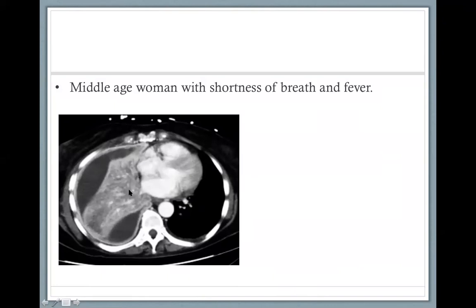And because it's collapsed, the blood vessels will crowd, so it will increase the attenuation and it will appear. So there isn't much air here, and it's becoming just like a soft tissue. So here, it is lung that is filled with air, which is outside the range of the soft tissue window. That's why you see it black. Here, there is no longer air. It's a collapsed lung, deflated, and all you see is the parenchyma with the blood vessels. So the attenuation now is within the range of the soft tissue window. That's why you see it. But you see it because it's abnormal.